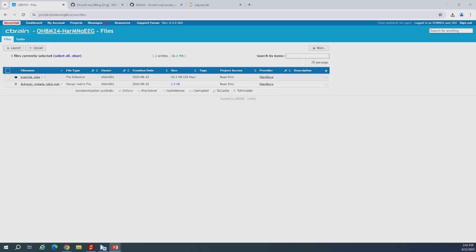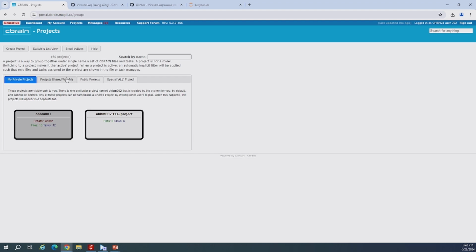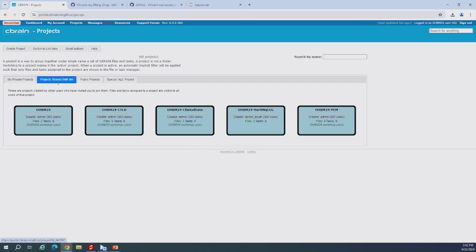Now, Brian is going to show you what we can do. Go back for them to know which data set they have to select. Okay, from here you can go to projects, then you go to project shared with me, and you can select this data.